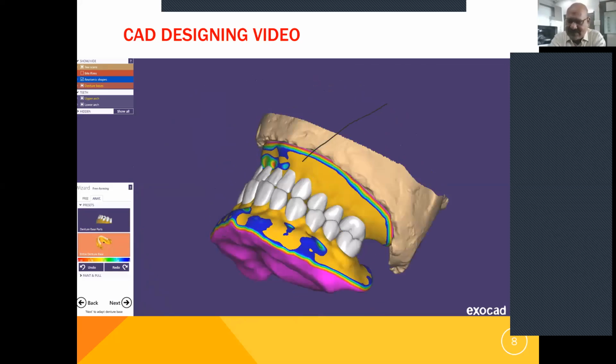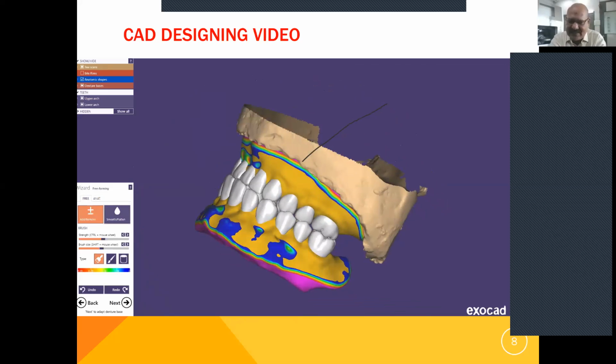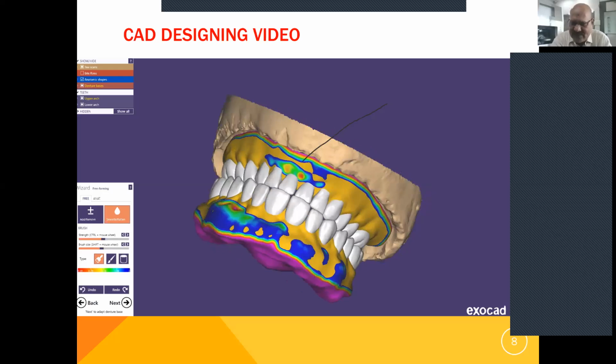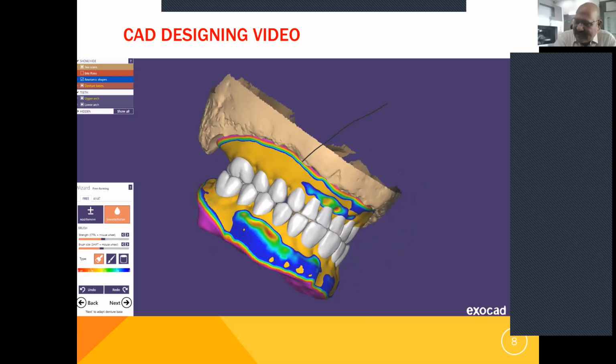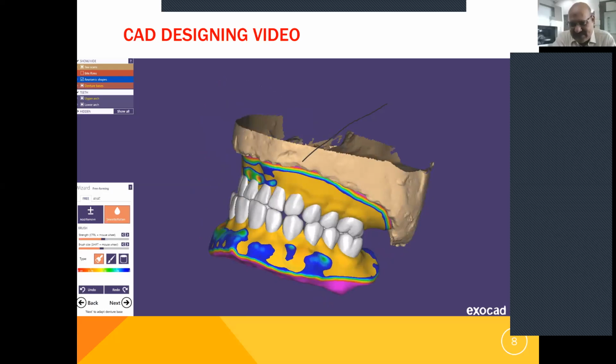We can go towards the end and there is a click of redesigning, or there are tools available to do fine tweaking anywhere required, even after the designing is completed. So it's as per the designer's choice. He can do whatever he likes.